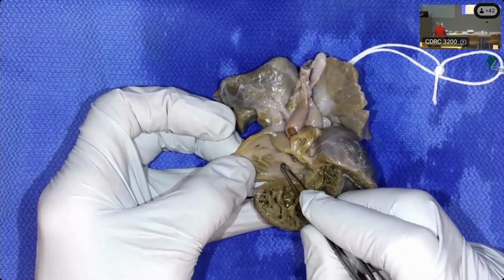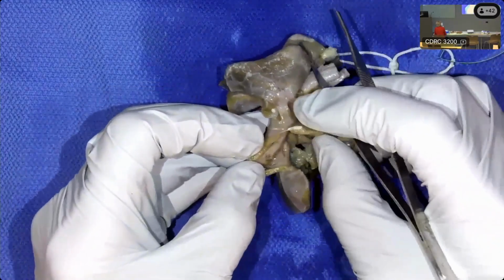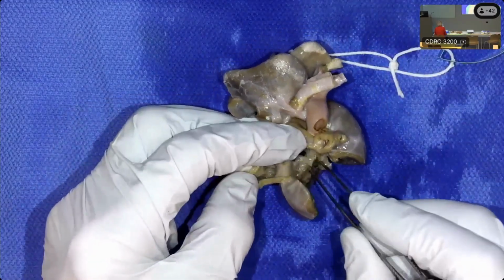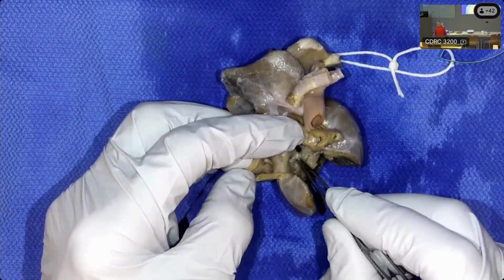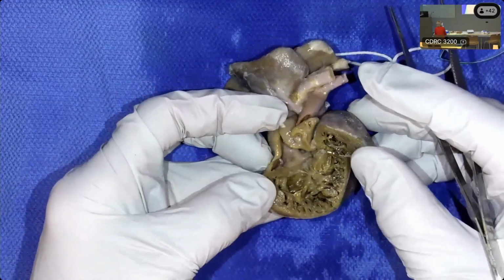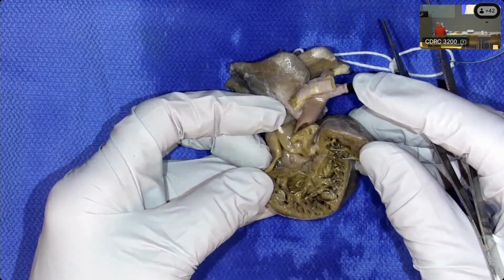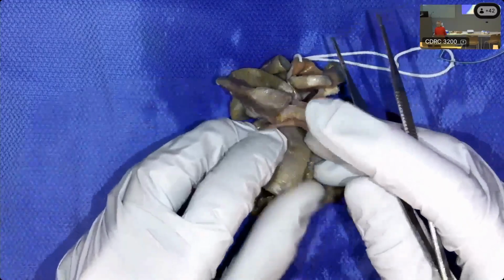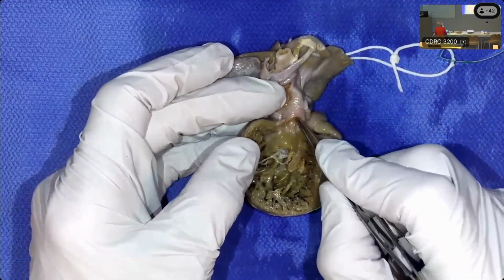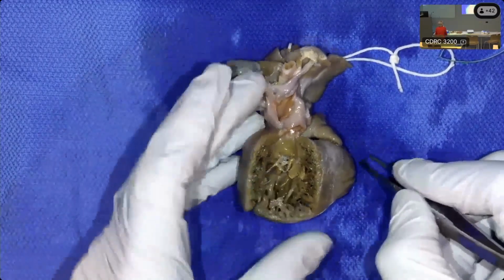But there is a coronary sinus. And the atrioventricular valve is a common atrioventricular valve with the bridging leaflets fused to one another across the crest of the septum. So this was a right dominant common atrioventricular valve. And you can see the increased trabeculations within this right ventricle. There were concordant ventriculo-arterial connections with the pulmonary trunk arising from the right-sided, morphologically right ventricle.